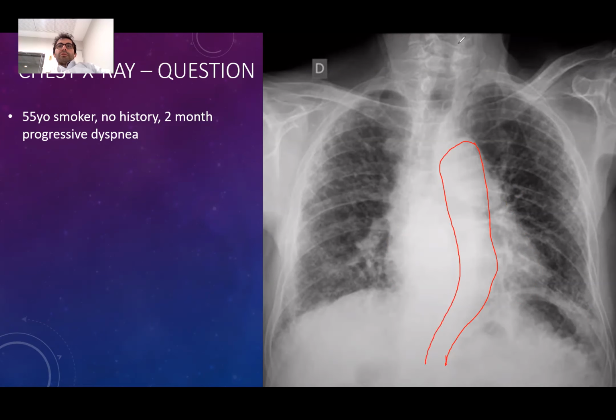So moving on, I have seen the aorta prominent, and I think the heart is enlarged, right? It is more than 50% of the thorax. So I have to say it is either on the limit or it is close to being enlarged. And also we have defined some findings in the lungs, right? We said there are reticular and nodular densities in both lungs, both on the peripheries as well, and on the central part, but more on the peripheries.